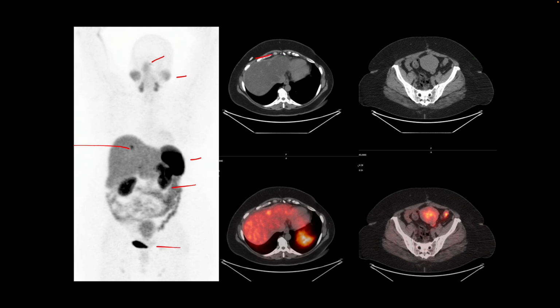On the cross-sectional images, we find that the liver is steatotic, and generally the tumors are hypodense, but because the liver background is so hypodense from steatosis, the tumor is appearing as hyperdense. So remember, the appearance of a tumor in the liver on CT and MRI images depends on what the background liver looks like. And the tumor usually, like I said, are hypodense, may appear hyperdense if the surrounding liver shows steatosis and is hypodense.